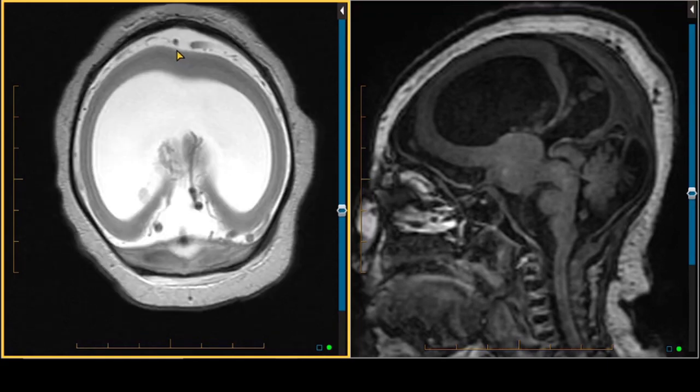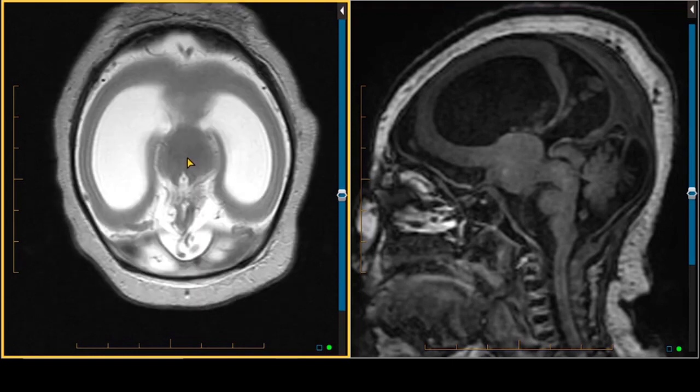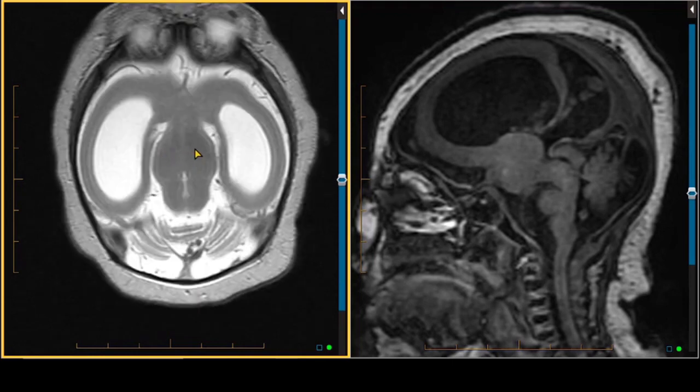We see likely what is a single anterior cerebral artery. Additionally, we see fusion of both thalami. Now, the cerebral hemispheres are part of the brain called the telencephalon. The thalami are part of the brain called the diencephalon. Those are the parts of the brain in a 5-part mature brain. But developmentally, in a 3-part brain, the diencephalon and telencephalon come from what's called the prosencephalon.